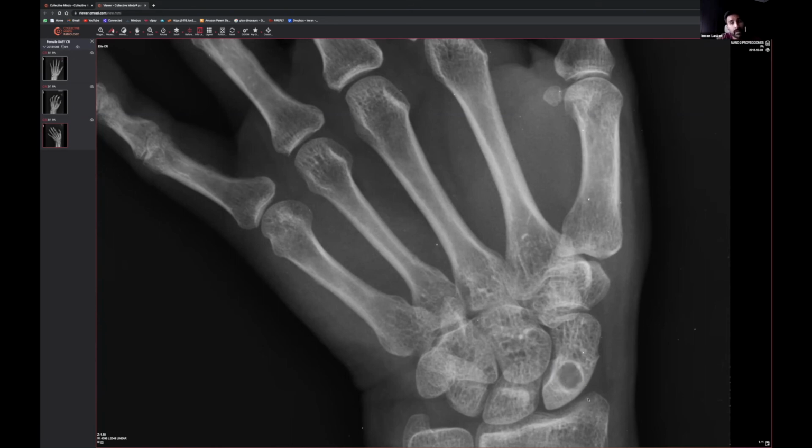As well. So it may be the case that they're going to fracture anyway, given the traumatic event that they had, but sometimes it can actually act as a bit of a catalyst. You get a fracture there, and the whole thing fractures all the way across because they've got what is otherwise a non-aggressive lesion, but resulting in some architectural weakness.